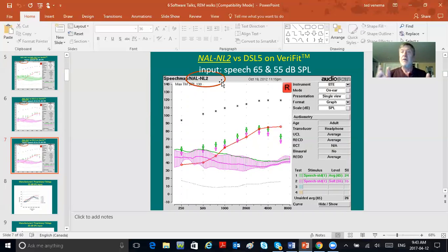And in a way, we said last week, the bottom line is to aid so that average aided speech is about a quarter to a third above the thresholds. And we said make sure Matthew, Mark, Luke, and John, which is 500, 1000, 2000, and 4000 hertz, those 4 frequencies are about a third above the thresholds. Look at here, it's even less with NAL2 here. It's probably like a quarter in some places, and some places even below. But that's NAL2. DSL is a little bit more, okay?